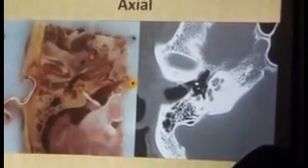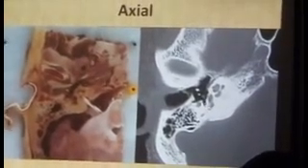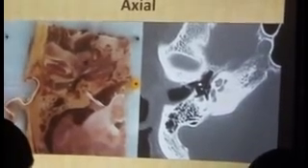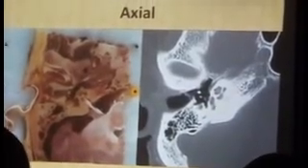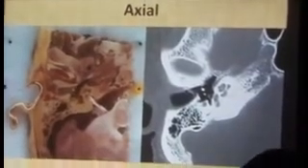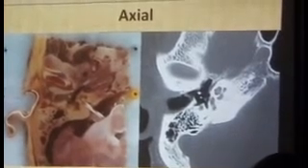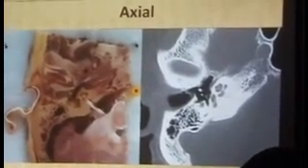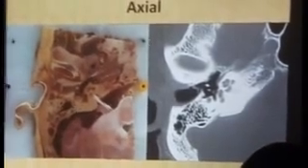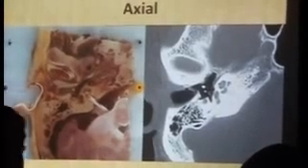This is your tympanic annulus. So this part now becomes a facial recess, and this part becomes the sinus tympani. That is why I said that this particular cut is absolutely mandatory when you ask for an HRCT, especially if you're doing posterior surgery and you wish to know what the depth of your sinus tympani is, whether it is possible for you to do a blind dissection, how deep does the soft tissue go inside, and so forth. So never ever leave a scan without searching for this particular segment.